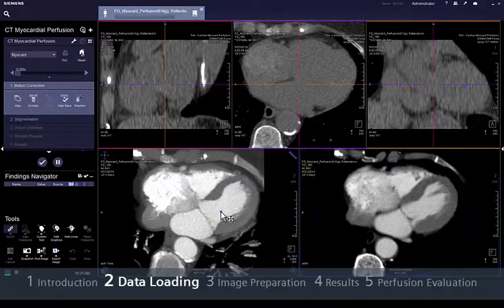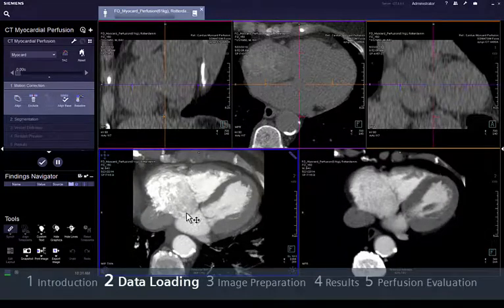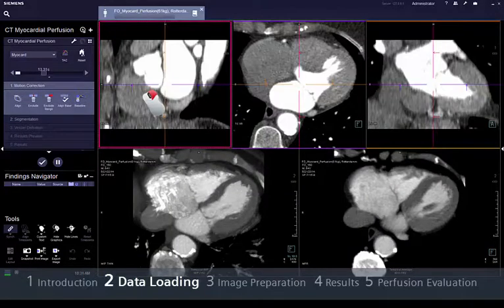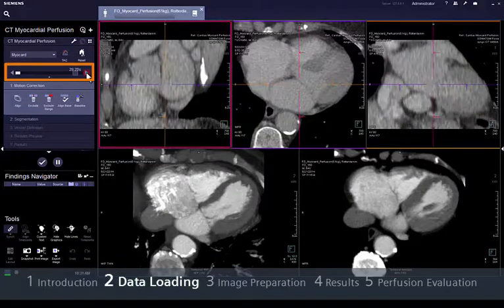Navigation can be done in any of these segments by dragging the mouse vertically while pressing the right mouse button. Window corrections can be done by dragging the mouse vertically and horizontally while pressing the middle mouse button. To navigate through time, use the upper segments and drag the mouse horizontally while pressing the right mouse button, or simply move the time slider.